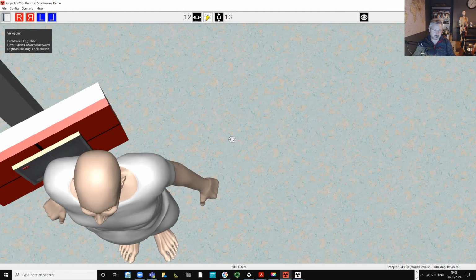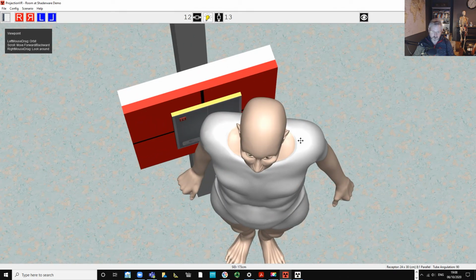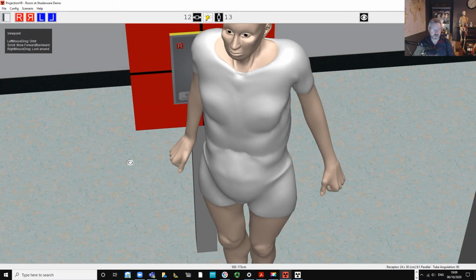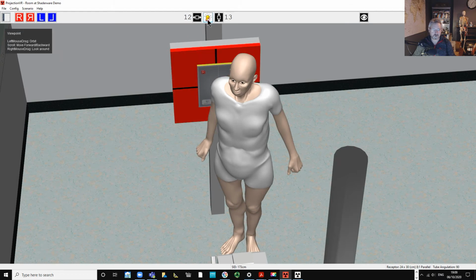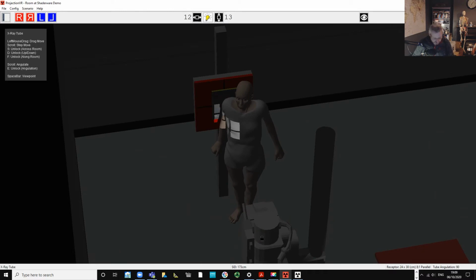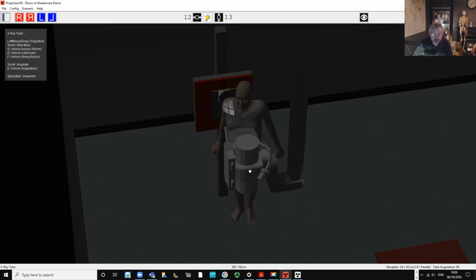This is what's called a right posterior oblique. Get her in her position as we want. We then bring the tube in to 100 centimeters source image distance, and then we raise this up to center at the coracoid process.